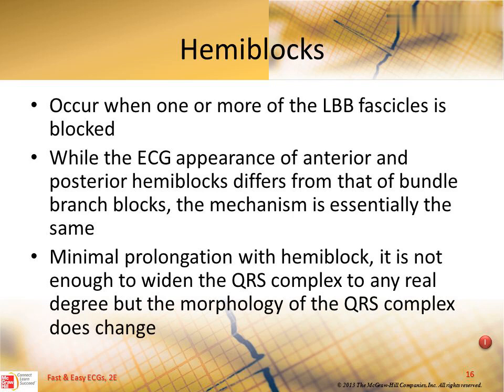Because the area of impulse blockade is relatively small, the QRS duration is generally not affected in either left anterior or left posterior hemiblock.